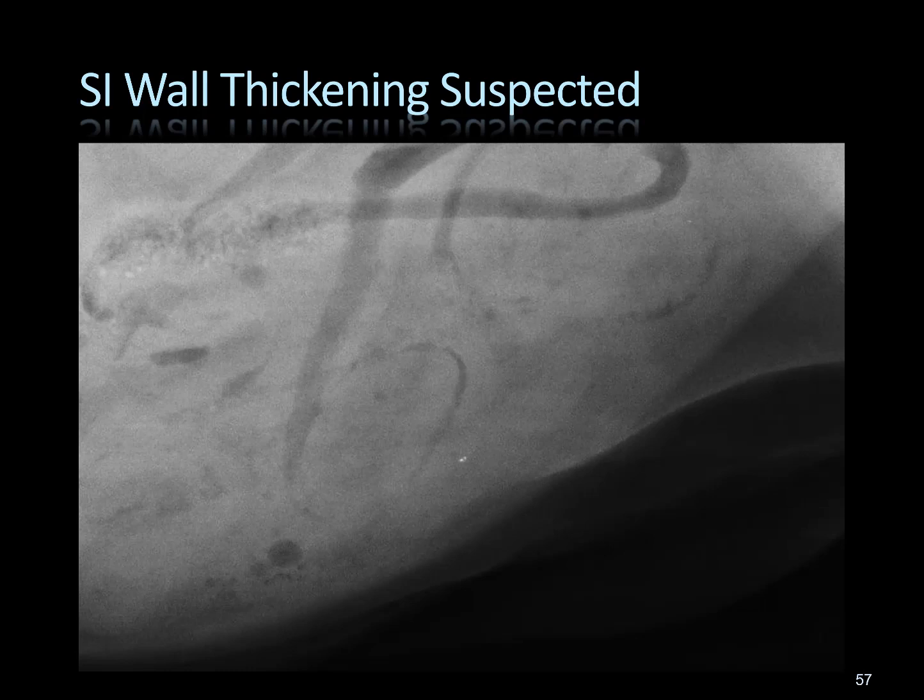And here's a case where I would think that, where you've got this little thin ribbon of gas. I can see one serosal edge here, another serosal edge here. So it's a pretty big intestinal segment. It's kind of chunky. And the margin of that gas and tissue is more irregular than I would expect for gas in fluid. So my concern is that there is gas up against the wall that is irregular, and the wall is thick.